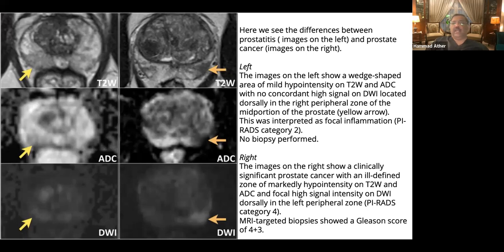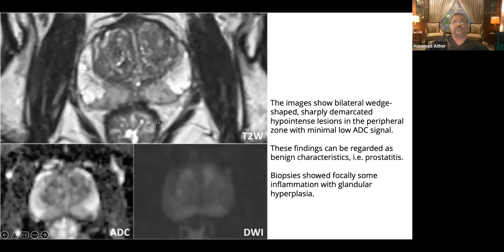And this would make it a cancer based upon size, configuration, prostatic extracapsular extension, etc. The characteristic, you will call it category 4 or 5, and then obviously order a biopsy for this set and not for this set, although the PSA values may be the same for both of these patients. But obviously one has cancer, the other one doesn't.